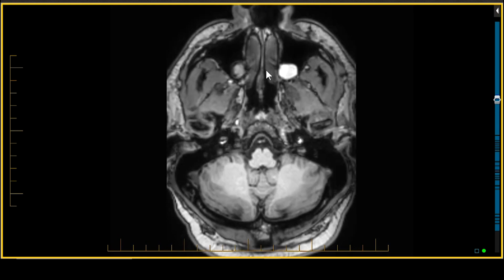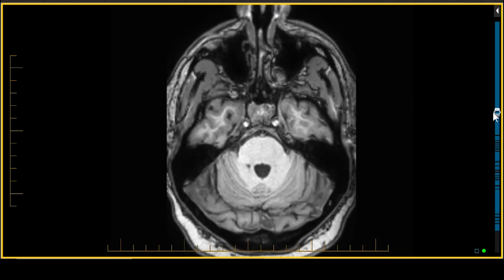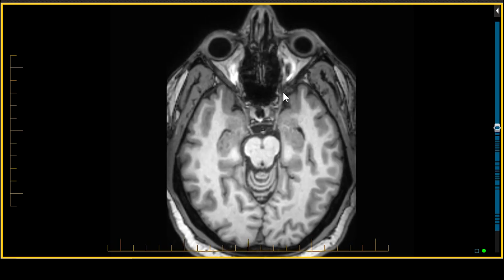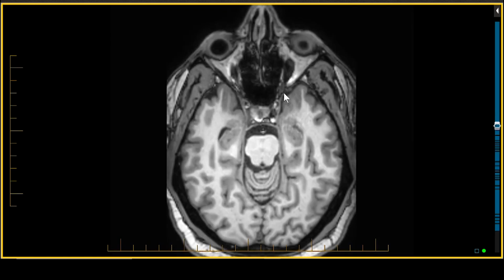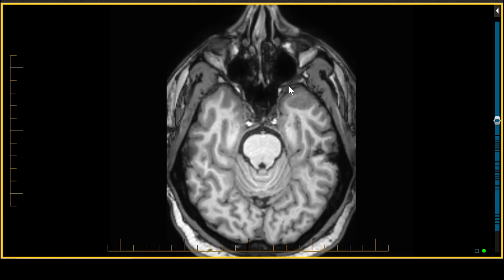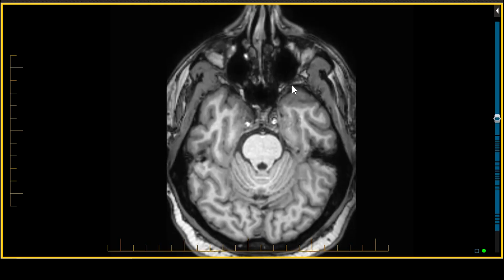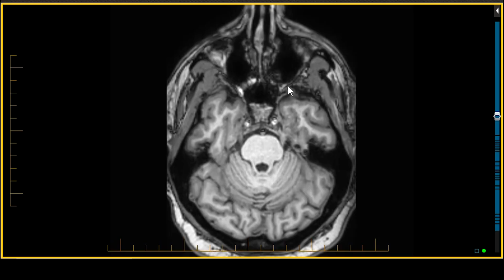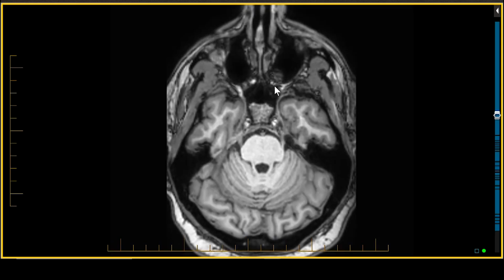As soon as we get to the maxillary sinus, now we're looking for the optic nerve. So let's go there as an important landmark, the optic foramen. And now let's work our way back down from the optic foramen, where we get into the inferior orbital fissure right there. And the inferior orbital fissure is going to transition into the pterygomaxillary fissure, the pterygopalatine space.